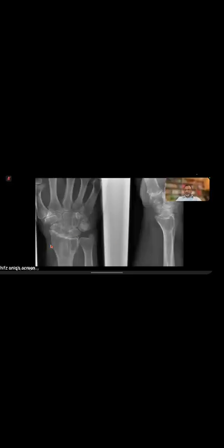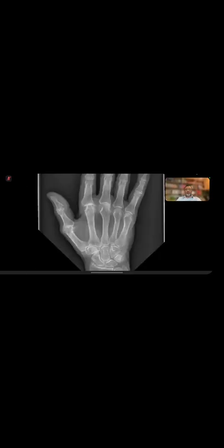No fluid or fluid levels to suggest this is a giant cell tumor. So going back, we don't need an MR scan to do that. I think it was done because it's not just a giant cell tumor. So this is a very typical appearance. You don't need to see calcification all the time, but if you see this appearance, think of CPPD. Somebody will come back. Don't worry about that, Gajan. It is coming. Okay.